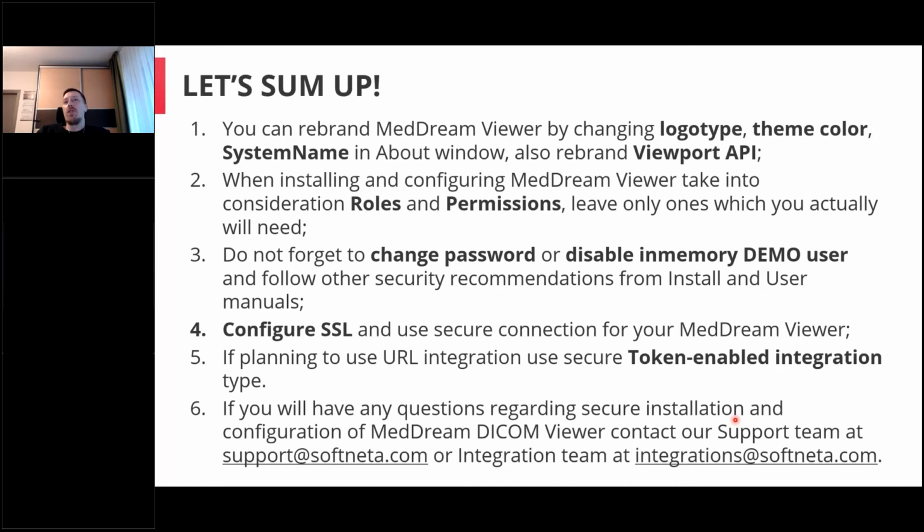And when you install and configure MedDream, take into consideration all these roles and permissions, and leave only the roles which are actually needed. It's better, I would say, to have fewer and then add, than to have broader ones and then make them lower.